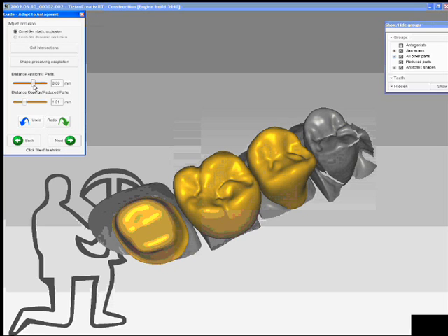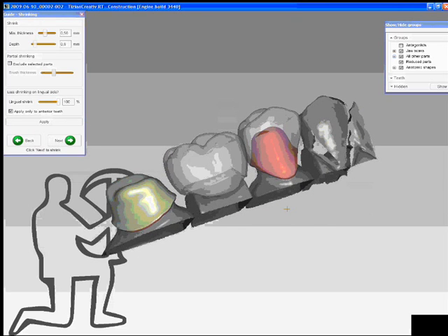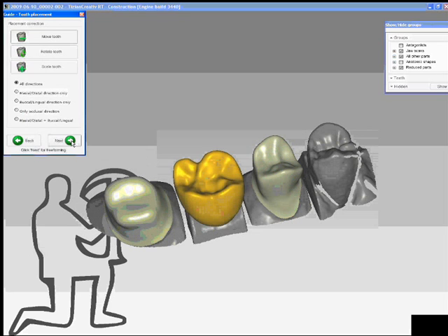In this case here, we reduce the complete anatomical crowns, so building up porcelain all around the crowns. Now the software takes your data and reduces the anatomical shape of the pontic and of the crown and keeps the basic shape, so you have a perfect support for the ceramic later on. There we go.